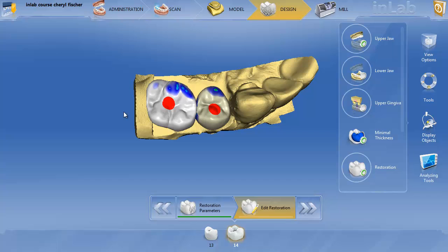And once you have everything designed, you would just mill out the custom abutments, and we'll go. And in the case of a bridge or a splinted unit, you'd have to re-image those to make the crowns over the top either splinted or in bridge mode. So hopefully that helps you understand the different options that you have to link together and parallel abutments for the cases of splinted restorations or Emax bridges or whatever bridge you're going to do.